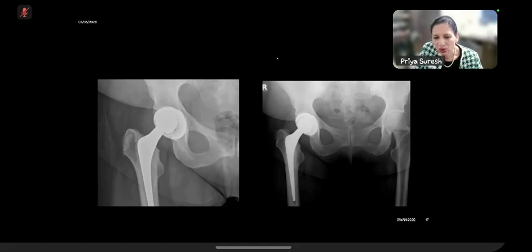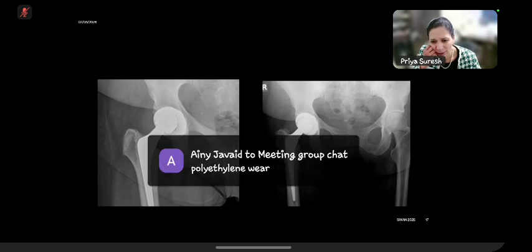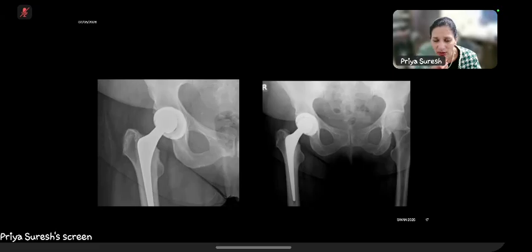Okay, so I just want you to look at what the changes are on the radiograph. What are you seeing? And I want you to think about what we have talked about until now regarding this loosened area that you're getting. We talked about the polyliner, so this is the lucency that you're getting.